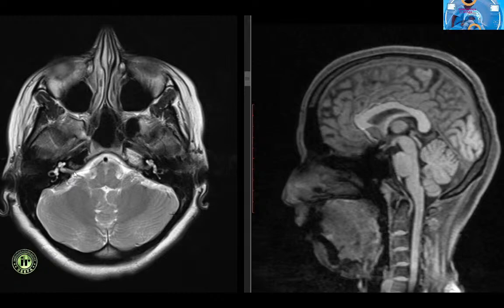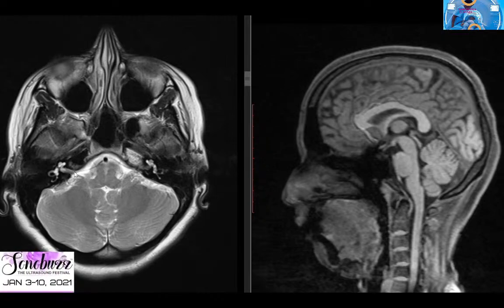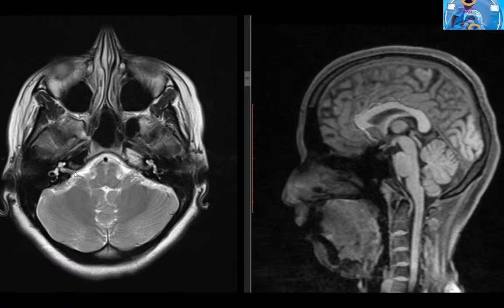Lastly, let us have a look at the meninges. The meninges have three constituent parts: the fibrous dura mater, avascular arachnoid mater, and the vascular pia mater. The subdural space is a potential space between the dura and arachnoid into which hemorrhage or pus may occur. Its existence is controversial in normal individuals. The subarachnoid space is between the arachnoid and pia and contains CSF. The pia is closely applied to the cerebral surface.